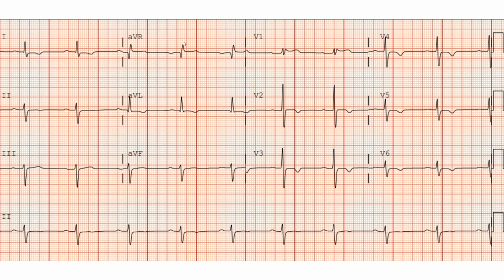Another interesting thing here is, number one, he has a terminal R wave, which is an R wave greater than an S wave in aVR or an R wave greater than 3 millimeters in aVR. That by itself is nonspecific. That can be a sign of toxic/metabolic abnormalities, but again, by itself, without any symptoms, you don't know to make any pathology out of this. And the other interesting thing is the appearance of V1 here.